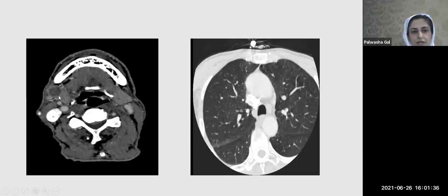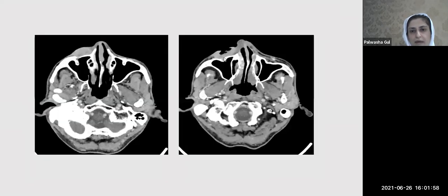So the answer to that would be no, because we don't do biopsies of the necrotic lymph nodes, because those are mostly inconclusive. So you would put a needle, you would intervene, the patient would spend money doing a histopath, but that would be inconclusive, and you know that already. So tell your clinician there's no point in putting a needle in a necrotic lymph node. Rather, it's better to do a biopsy or tissue diagnosis of the lesion, which is there in the malar soft tissues, okay?